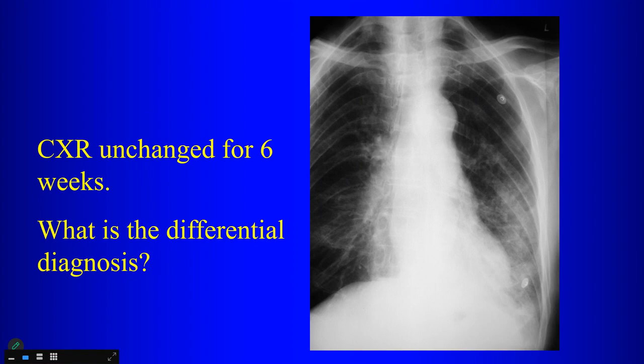So eosinophilic pneumonias or chronic eosinophilic pneumonias can give you consolidations. Typically they are bilateral, right? Peripheral consolidation. So yeah, if you have peripheral consolidations, that can be in the differential. This seems to be one. There doesn't seem to be any others, although I haven't shown you the entire right lung. What else is in your differential for chronic consolidation?